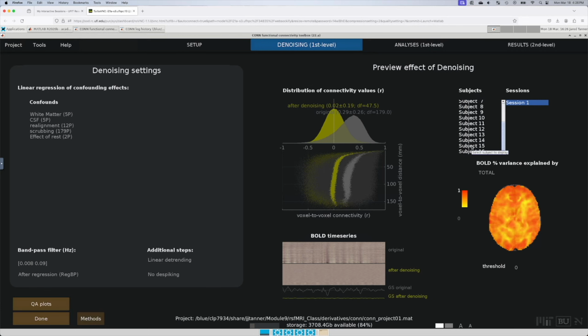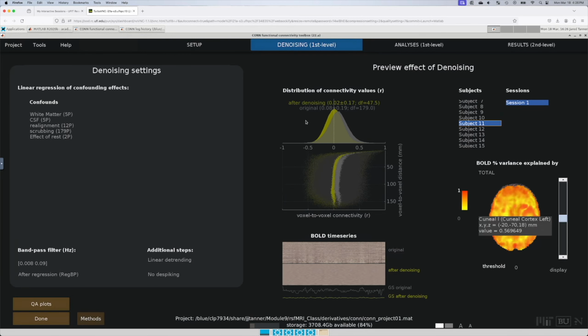So before, one of the problematic ones was subject 11, and we had just a solid red, and these distributions looked weird. Again, technical term, weird, but this is not that participant. They have now been removed from the data.